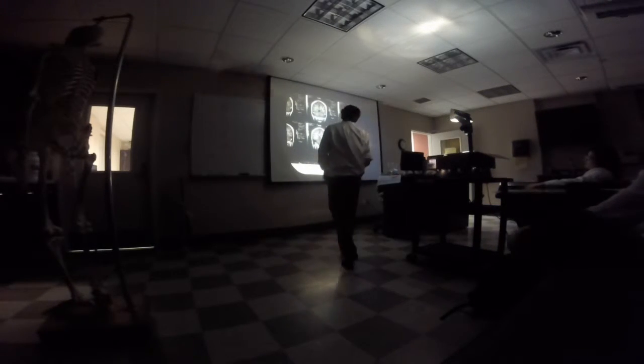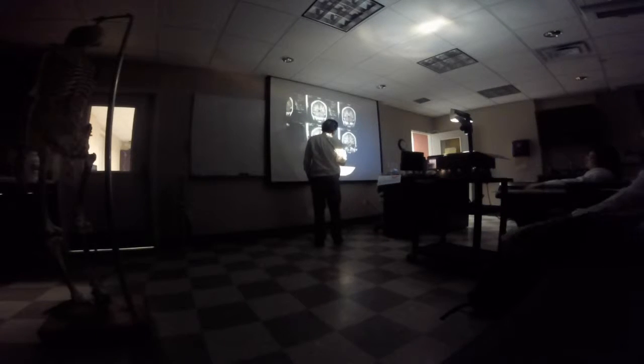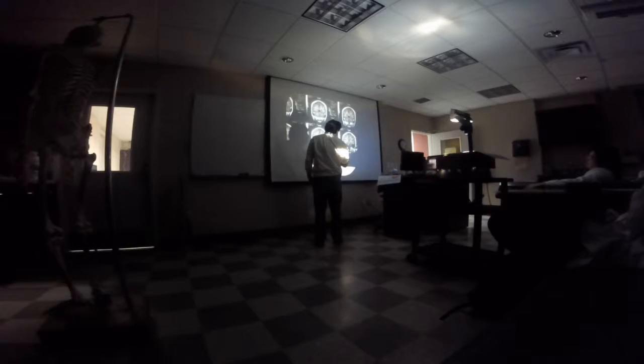Now, this right here is the midbrain. This is where it's passing through that tentorial notch. Here, this more expanded portion is going to be the area of the pons.